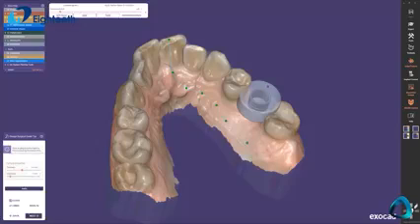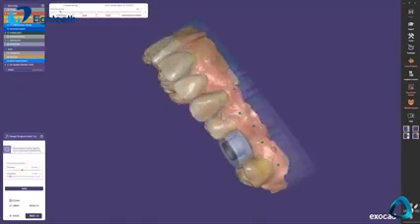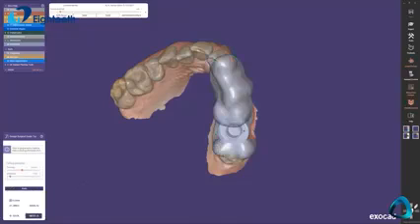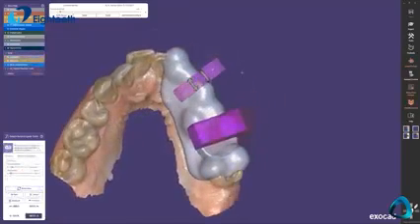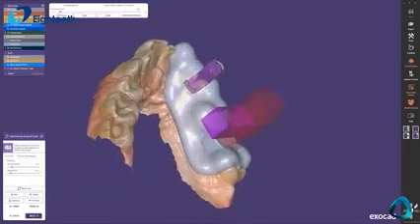Once this is done, you design the top of the surgical guide. This starts by placing a margin line to marginate the edges of the guide. Using implant guide software, you can also add attachments to the guide. These can be windows to confirm accurate fitting of the guide in the mouth, supports to reinforce the guide, or text such as the patient's name that can be embedded onto the guide.